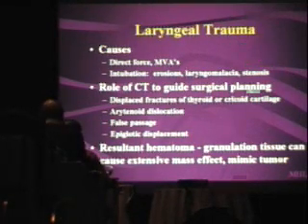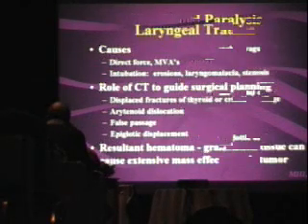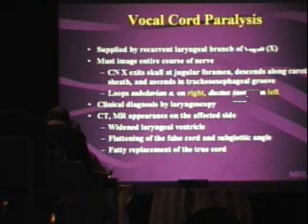So you could also get, after trauma, laryngomalacia, stenosis of the airway, erosions. After intubation, you could get that as well. So just be on the lookout for it. This is more of an eye test, but definitely be on the lookout for it and realize that granulation tissue can mimic a tumor in these healing reactions, all right?